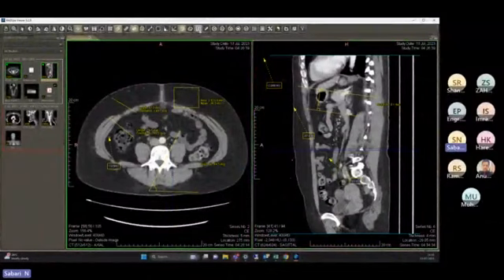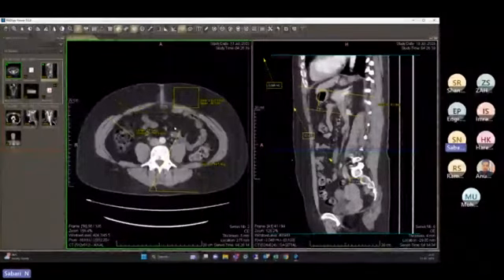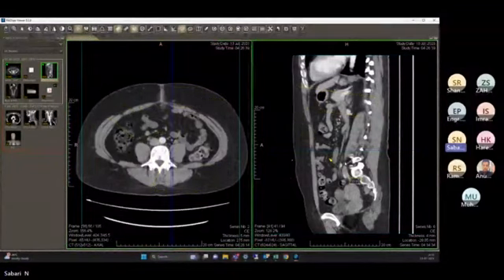If I just click on the recent, right click, delete annotation, there is a function delete annotation. If you click on that one, all of this will go back. If you directly close that image and reopen, that will also go automatically.